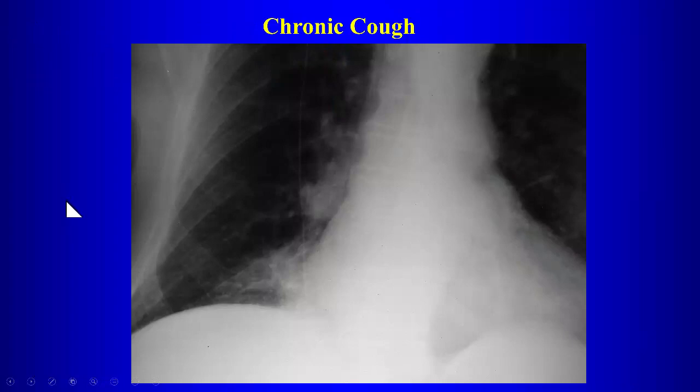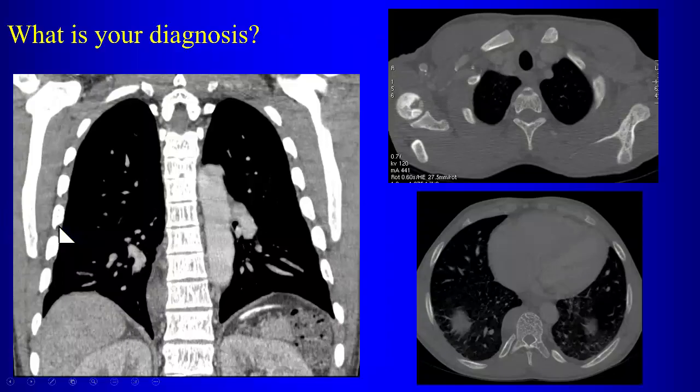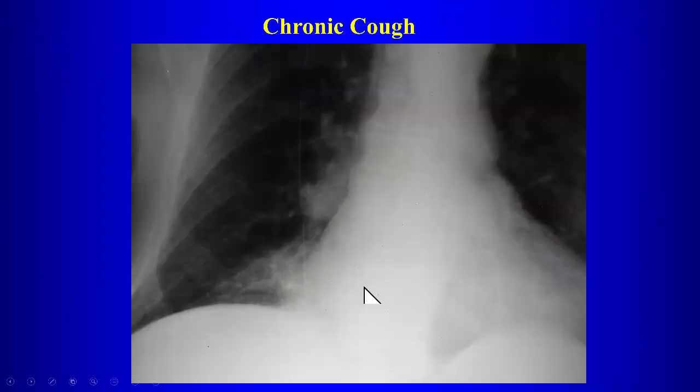So this patient has a chronic cough. The finding is... is that normal? Maybe a vascular mass. Yeah. It's a kind of opacity down here, right? So we think this might be... Chronic cough? Could be pneumonia. Could be pneumonia. Oh, that was our sickle cell case.